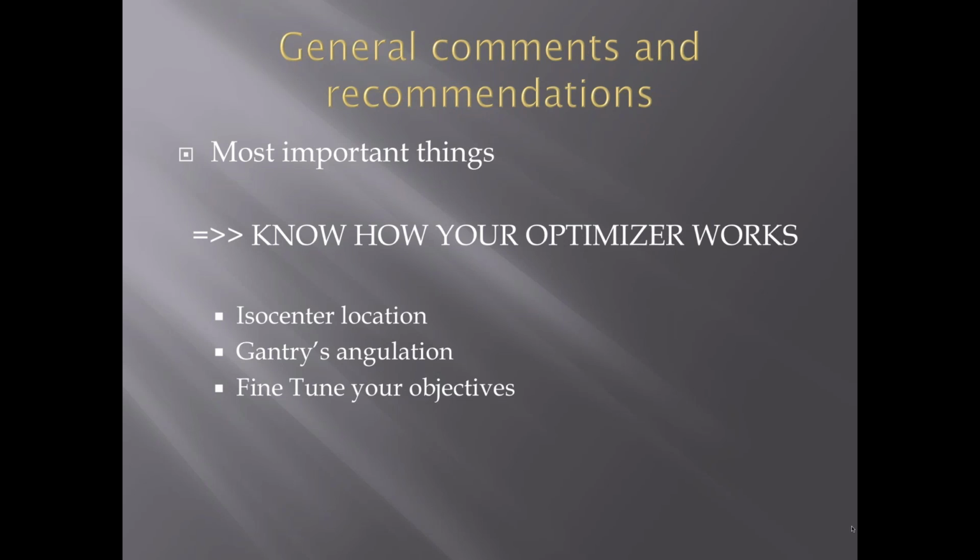And the second very important thing is the isocenter location, the gantry angulation, and to fine-tune your objectives gradually.